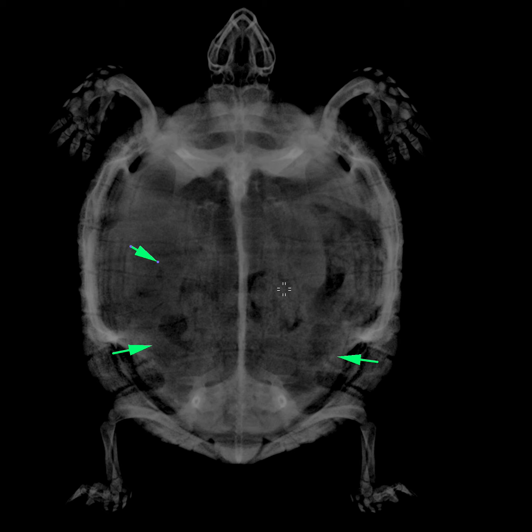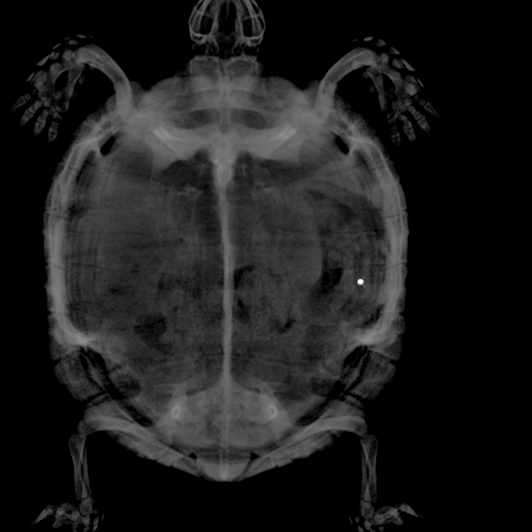Of course, differentiating this is quite difficult, but in this case, we are sure that the digestive tract, apart from the stomach, appears within normal limits because we have only a small amount of gas and we have poorly delineated soft tissue material which reflects ingesta.